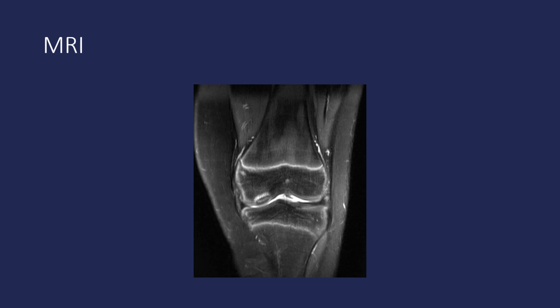Here we can see an OC lesion of the lateral femoral condyle. Notice how there is an outline of edema around the lesion, but it appears to still be contained, so it's likely a stage 3.